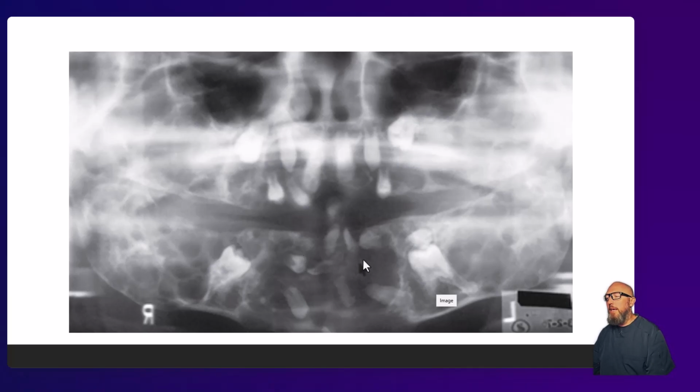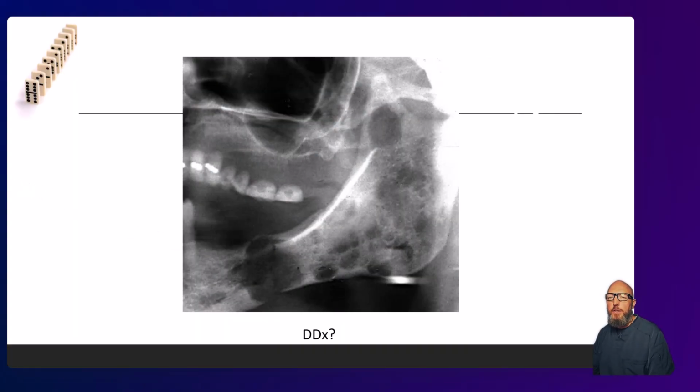All right, how about in this case? Looks like a lot of teeth are missing. It looks like these teeth are underdeveloped. Not really sure what's going on with the dentition, but this is an 8-year-old boy. Had this going on for a while. It is very bilateral, pushing these teeth anteriorly. And now this is a case of cherubism. Bilateral, symmetry, posterior expansile, young patient, very young when this onset. And so that's your classic cherubism.